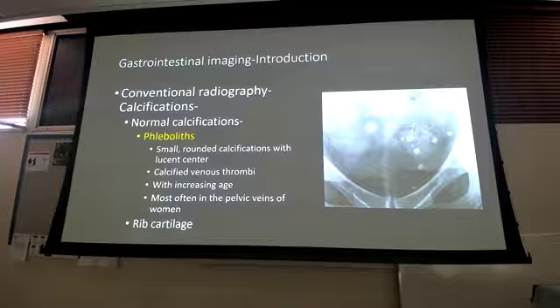These things, if you measure them, are bigger than 5 millimeters. And on top of that, they should be sitting down here if they were stones in the bladder, right? Depends, is she upright or not? Because the posterior bladder can be sitting right here, but you're not going to see stones in the bladder typically on an x-ray. When they're that big, they're going to be phleboliths.